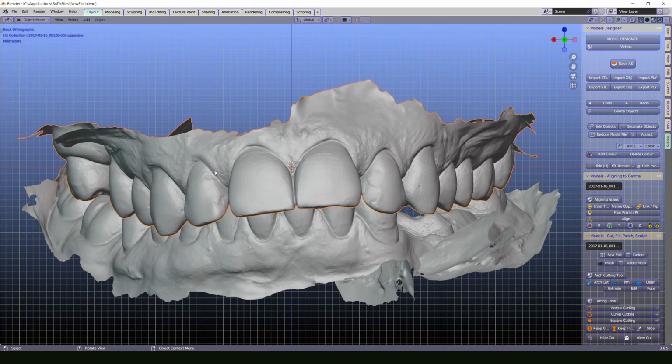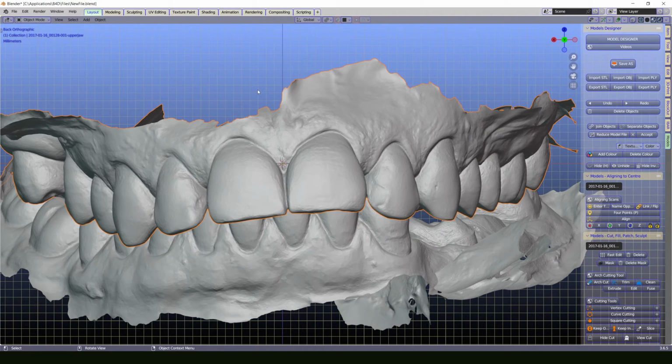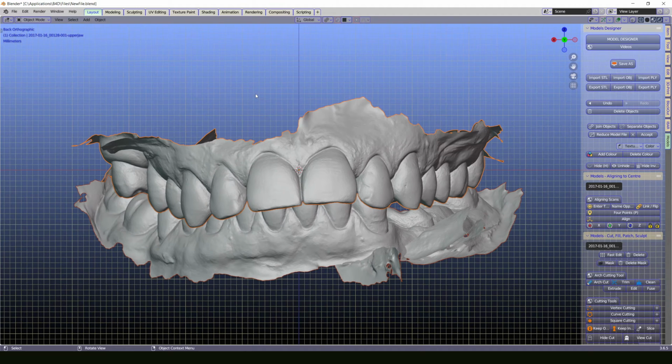But in this case, I won't be using any articulator or other stuff. I just need an express way to go further and to make those models. I need to print them. I will need something to check my occlusion and to check my approximal contacts.